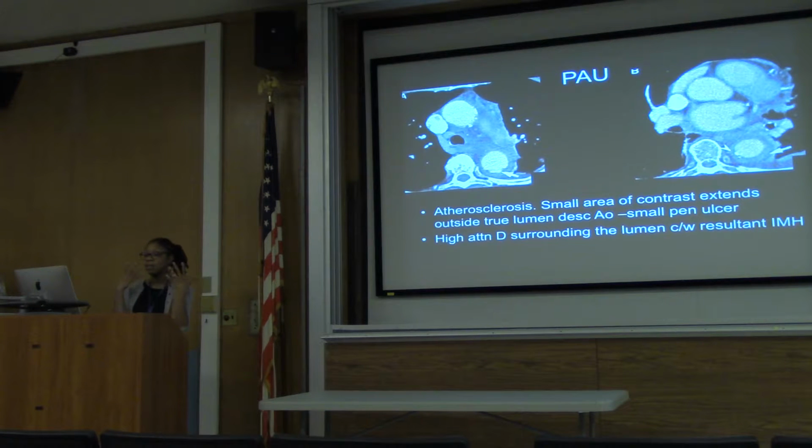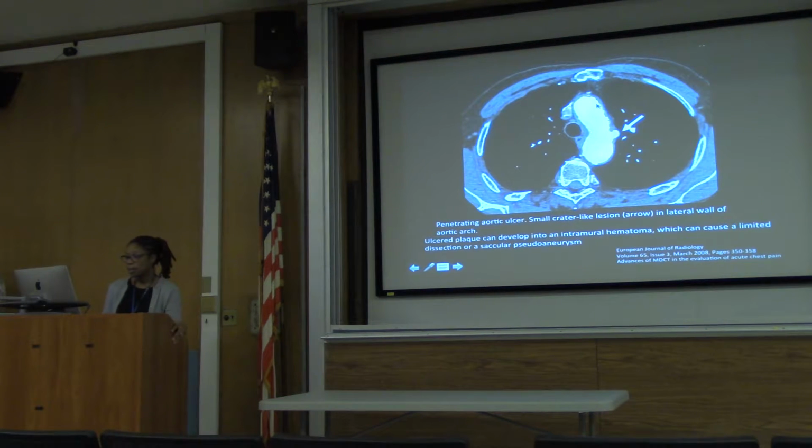So if this was in the ascending aorta, the patient will be treated surgically. If this is in the descending aorta, it will be treated medically. Another example here of the aortic arch.